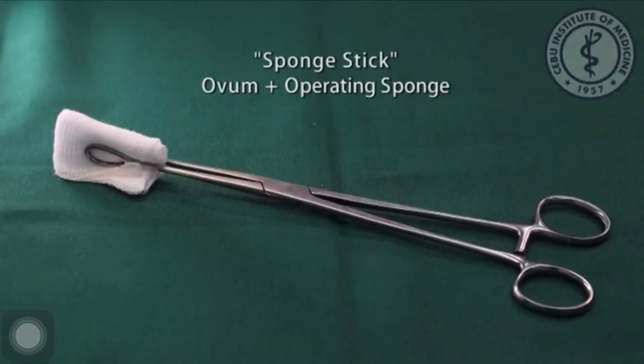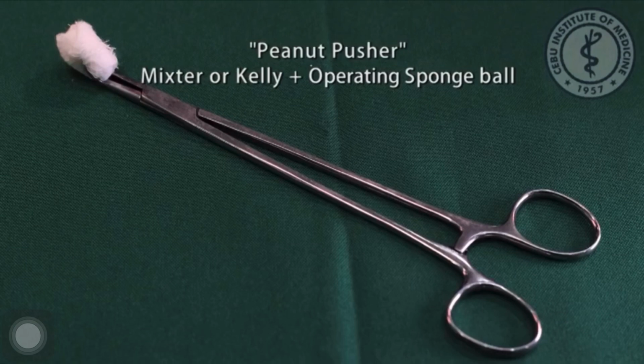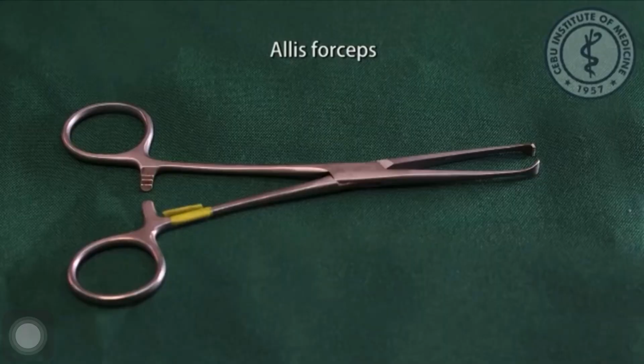Ovum forceps, sponge stick: ovum plus operating sponge, for blunt evacuation of blood clots such as in exploration. Mixter forceps, peanut pusher: Mixter or Kelly plus operating sponge ball, for blunt dissection. Babcock forceps, for grasping hollow or visceral tissue. Allis forceps, for grasping connective tissue.